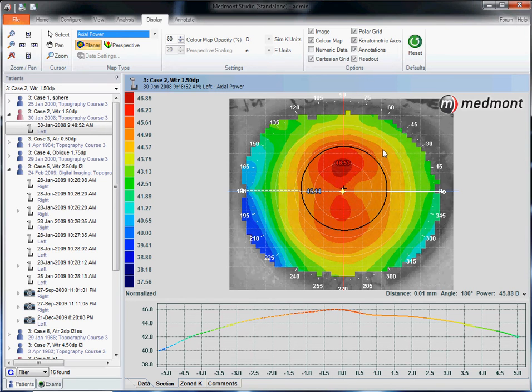As we go farther out in contours, we notice the green-yellow border appears to make an almost concentric circle, indicating the astigmatism is coming to an end. So this is your apical astigmatism. This is a patient that does very well in symmetrical orthokeratology lenses, in other words, non-toric orthokeratology lenses.